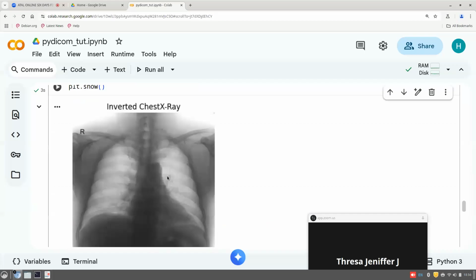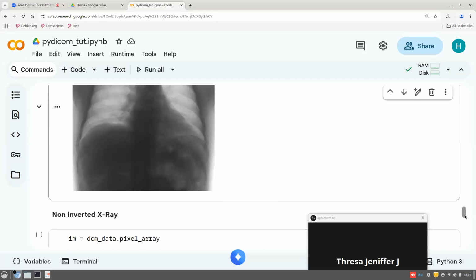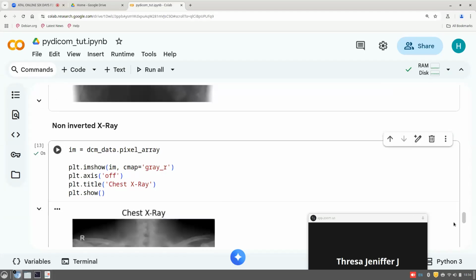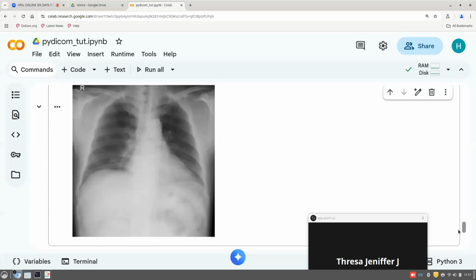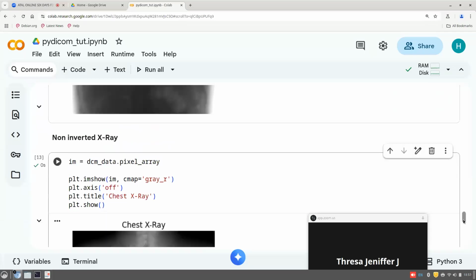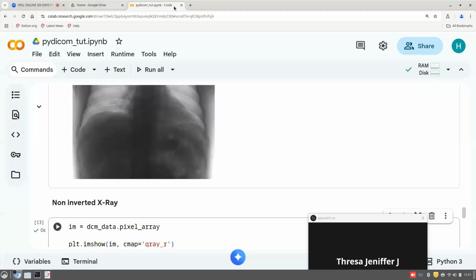This is generally used by doctors to identify diseases in case the disease is not properly visible in the input image. These inverted X-ray images can also be plotted using libraries like matplotlib, and original X-ray images can also be plotted for DICOM images using the PyDICOM library.